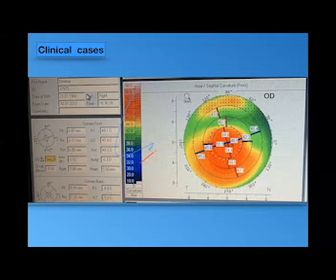I found, after getting this Pentacam, that K1 is 49.1 and K2 is 49.4. So the difference between both is insignificant, but still the same and steep.